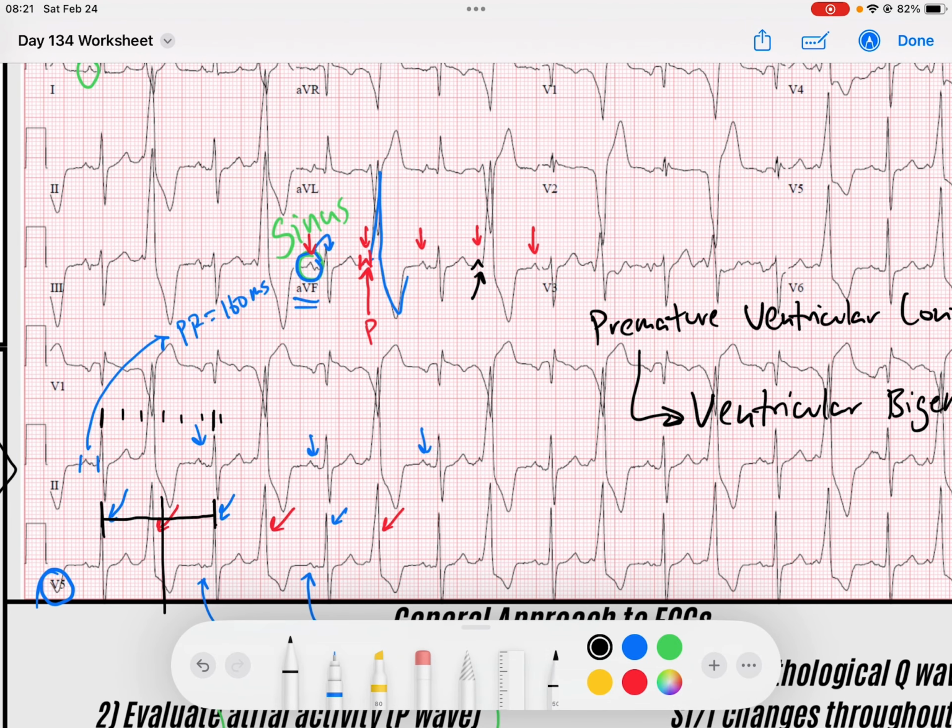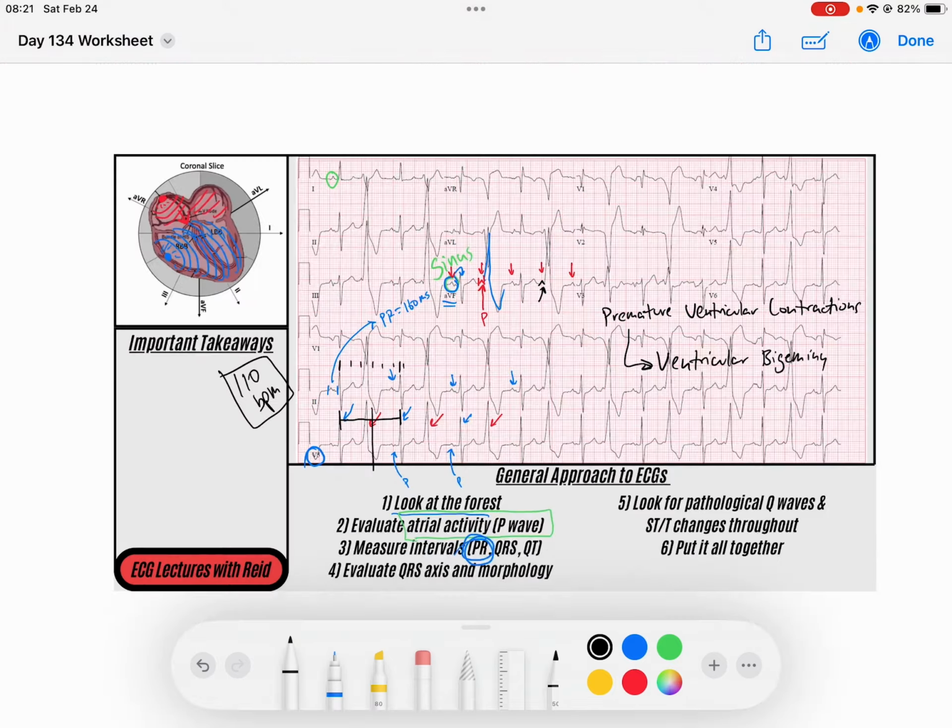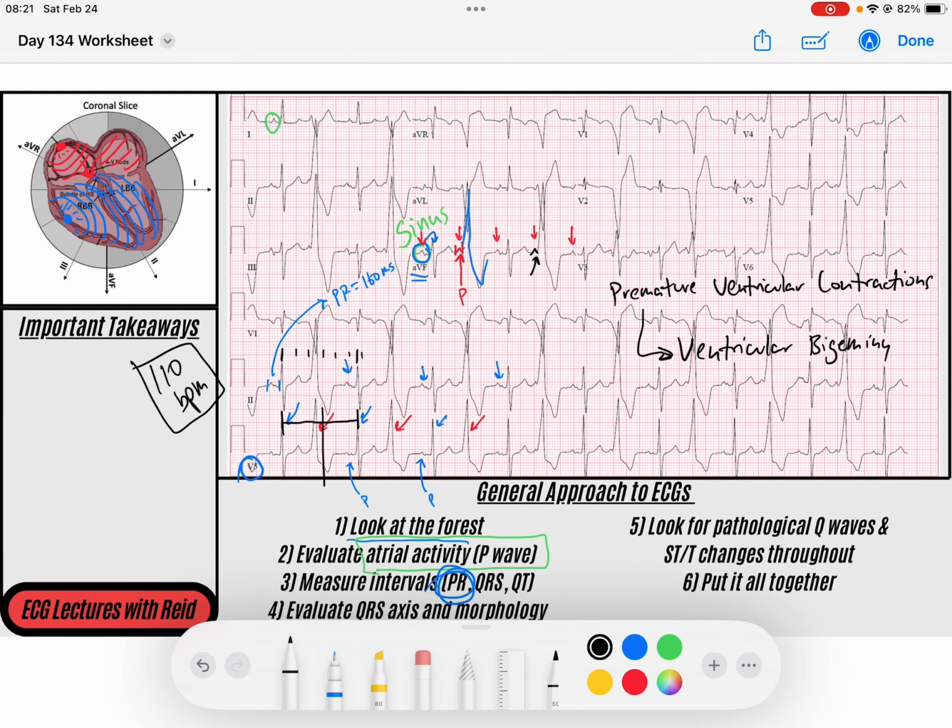We got this P wave, and then the QRS is coming in before the AV node can conduct that signal down. And so it's essentially canceling out that P wave. It's not letting the P wave conduct down. So that's what we're having. That's what these red arrow beats are. Pretty neat, right? So that explains a little bit of our AV node behavior, why those next P waves aren't causing narrow complex beats, right?